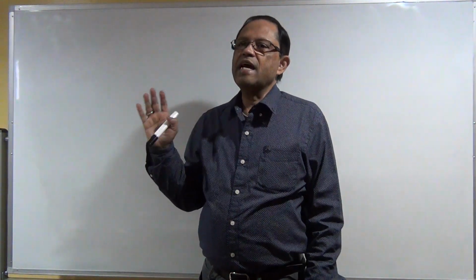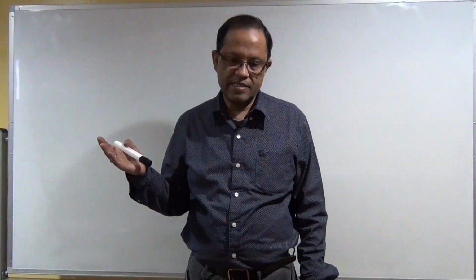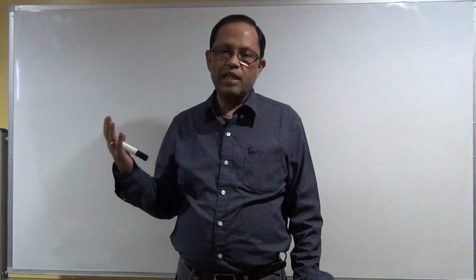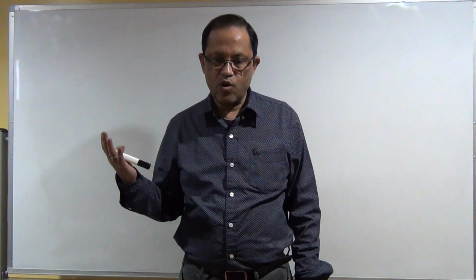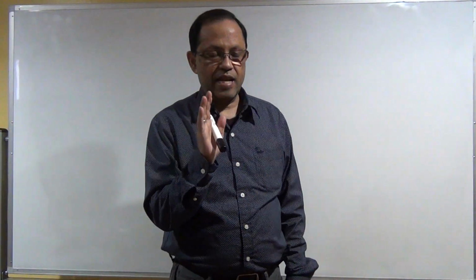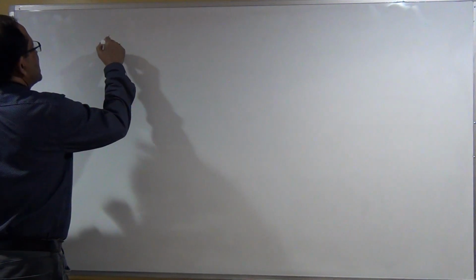But when there is a pathology, we need to know how it looks, what is the sonographic appearance and characteristics, how I'm going to describe it, and what would be the effect of enlargement of the parathyroid gland on the thyroid gland. If there is a mass in the parathyroid gland, how is it going to push the thyroid gland, so that I will say, oh, this is not a mass in the thyroid gland, but it is in the parathyroid gland. Okay, let's explore the parathyroid gland.